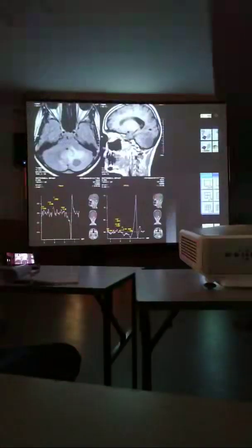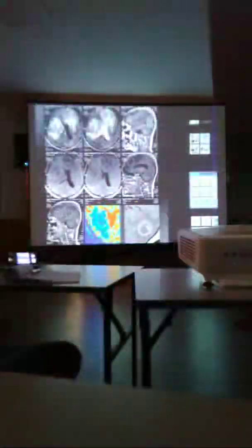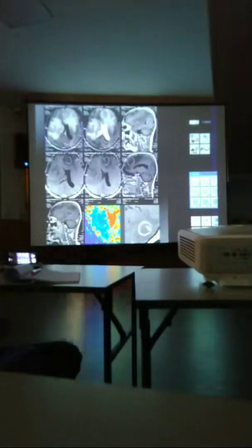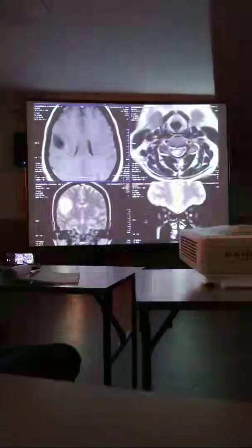Tuberculoma, caseating, T2 hypointense, central low signal, that is very characteristic, and the lipid peak will be there. Toxoplasmosis, central low signal, eccentric target sign, hemorrhagic in nature, low CBV, PET negative. These are all very classical features of toxoplasmosis. Demyelination, it is tumefactive demyelination. You can see the inner surface alone will enhance, and a broken ring will be seen toward the cortical surface. This is incomplete ring enhancement. This is classical of demyelination. Thank you.